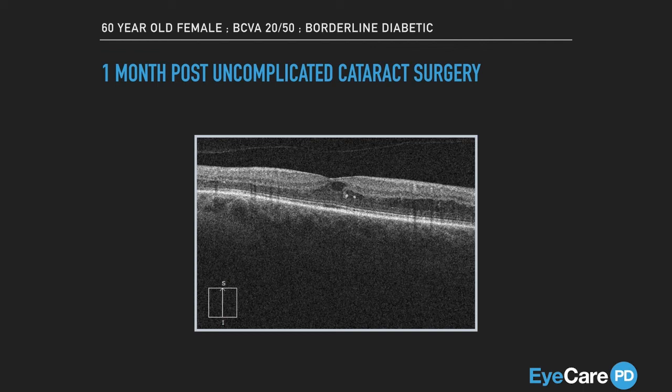Well, a couple things. One, you've got this cyst. The cyst has a relatively empty pattern to it. It's relatively central as well. You've also got these hyperreflective foci. Hyperreflective foci can be many things, it's true, but often they're exudate. So we've got hyperreflective foci, this cyst. You're wondering, could this be an empty cyst of post-op CME?